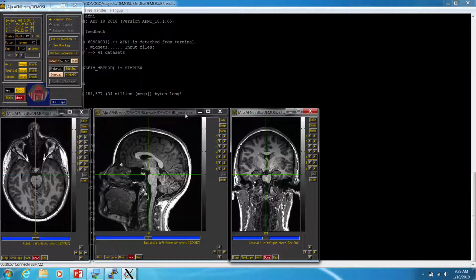So this is the T1 anatomical image, the structural image that they take at the beginning of our scans, that shows us the structure of the brain, and it's really high resolution. This is the kind of thing that makes your results look real good when you put them in a published figure. I'll talk a little bit about that later. But this is actually this individual subject's anatomy.